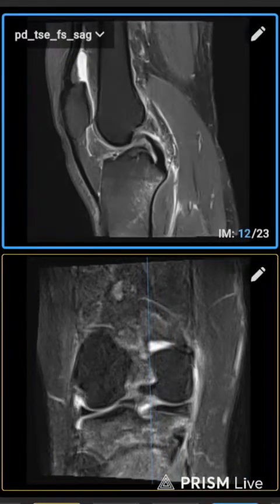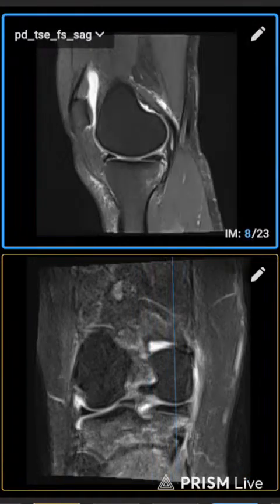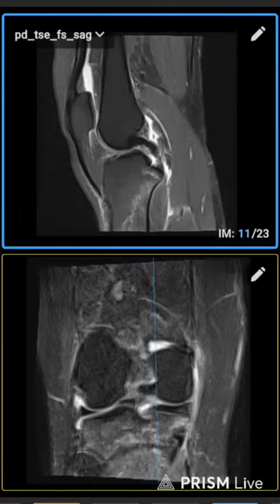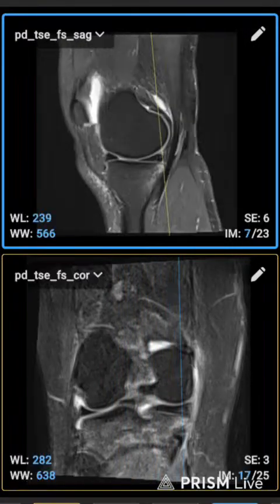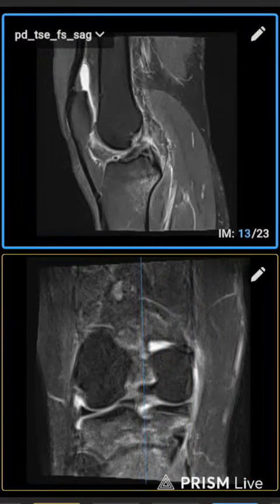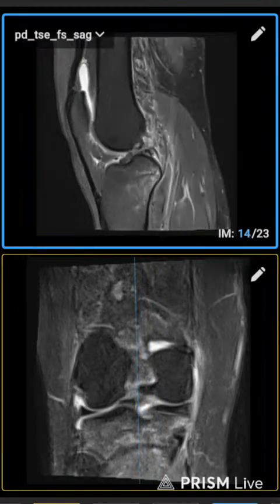So this is the problem of this patient. It's simply showing in a 3 mm or 3.5 mm sagittal slice of T2 and PDFS. It's properly showing. If there is any injury of the ligament, it's called a tear.